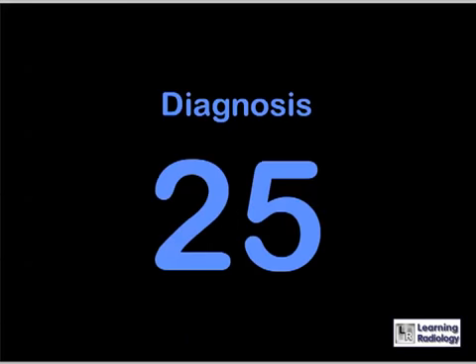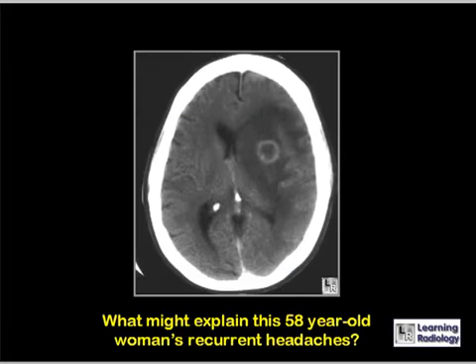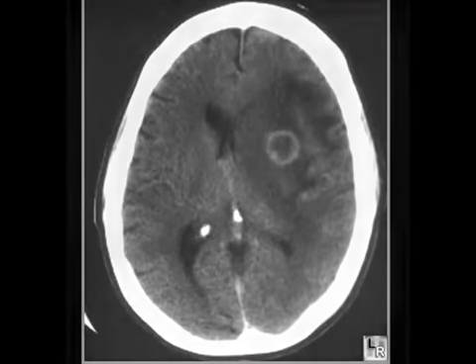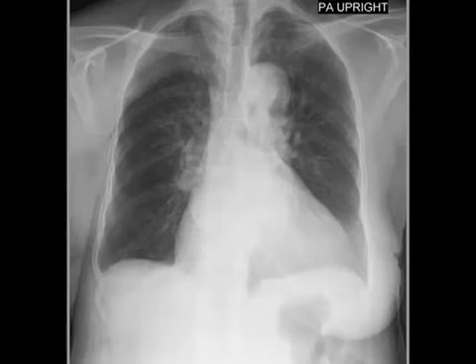What might explain this 58-year-old woman's recurrent headaches? And here's another image which I haven't shown you, which has another finding.